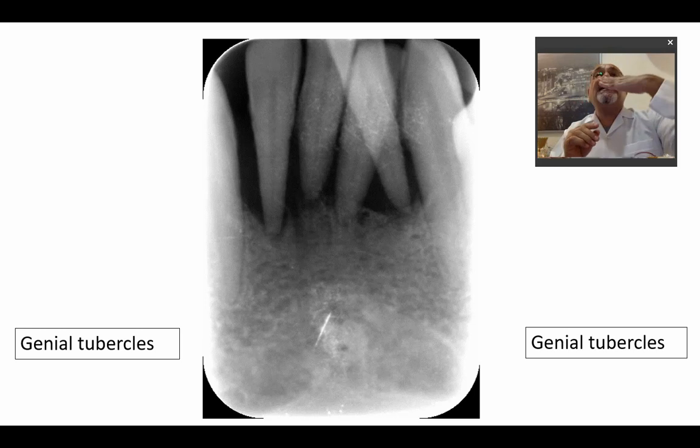If you take an occlusal radiograph and you extend the film from down, then you will find the genial tubercles extending posteriorly. So this is another thing that we should take care of in 2D: when structures fall within the path of the X-ray, you will not see them, you will lose depth. If you want to see it, you have to look from the underside, and this is when you change the technique or change the relationship between the film and the structure itself.